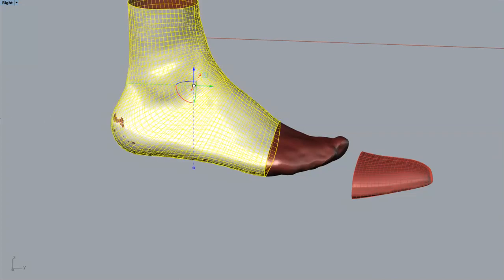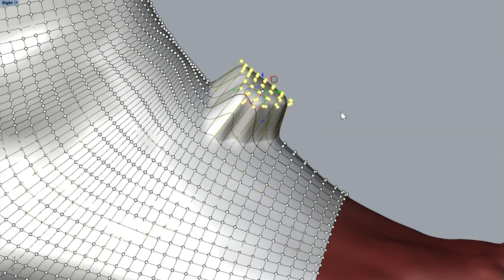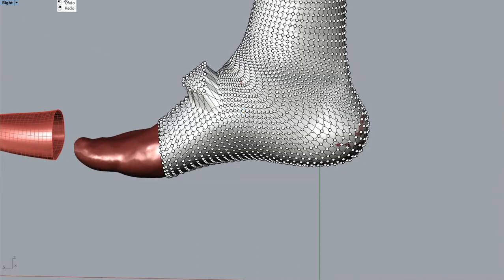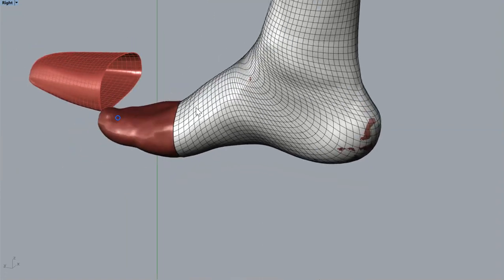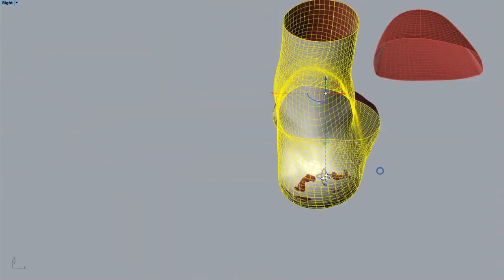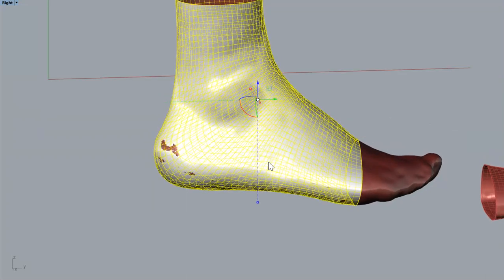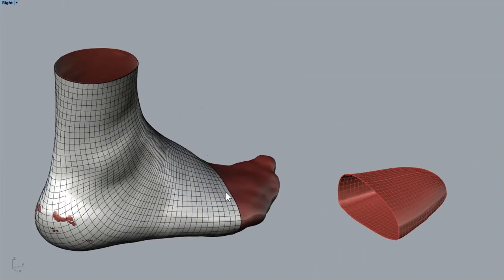But this is a surface that is hard to modify because it has a lot of control points. Less than the mesh, but still. It's very hard to model a last out of this. What you can do is just leave it this way, don't change too much. You have the idea, okay, my cast was perfect, so I don't have to change much. I'll leave it like this. When it fits around my cast, I'm happy.